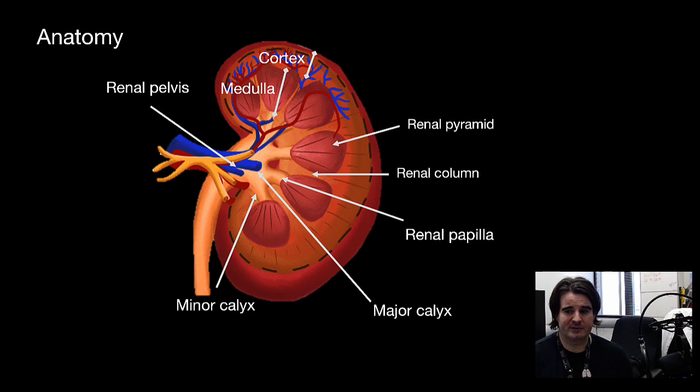You need to be fairly comfortable with the anatomy of the kidney. This can actually be seen pretty well in some patients, even in grayscale imaging. Beginning with the layers from the cortex to the medulla. Within the medulla, we see the renal pyramids, which drain through the papillae into the minor calyces, then into major calyces, and then to the renal pelvis and to the ureter. The pyramids here appear striped. This is by straight and parallel segments of loops of Henle and collecting ducts from the nephrons.